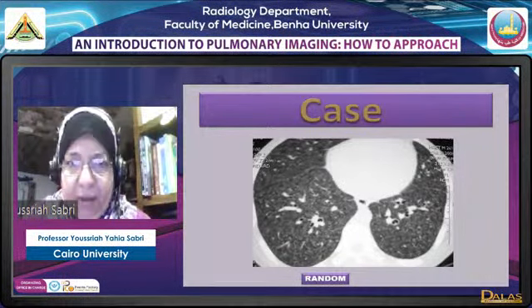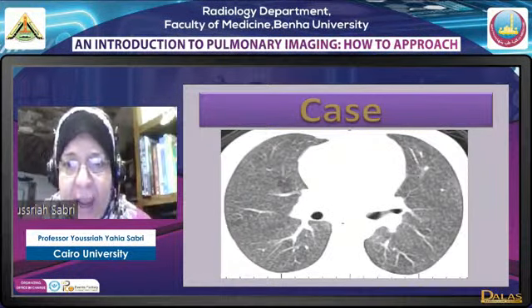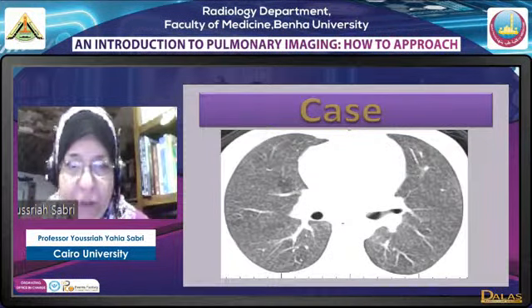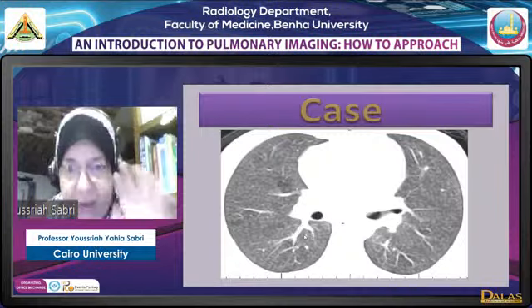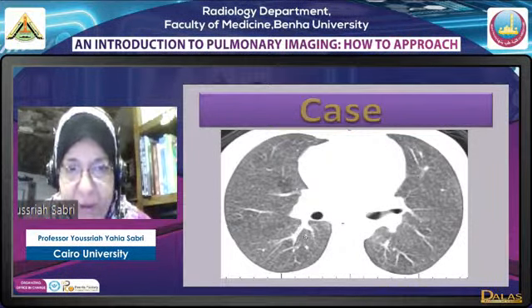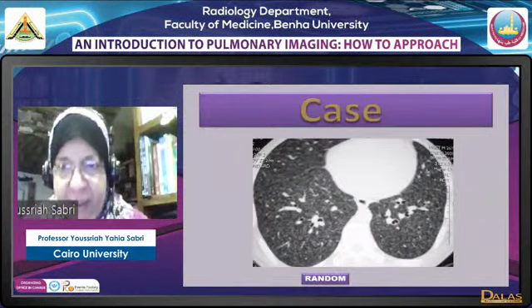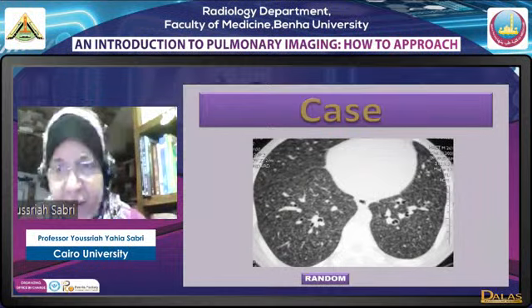If, on the other hand, we do not discriminate the fissure, or we see the fissure as a hyperlucency, this is a centrilobular nodule, and this is pathognomonic of subacute hypersensitivity pneumonitis. This is random, this is miliary, this is a 26-year-old male.